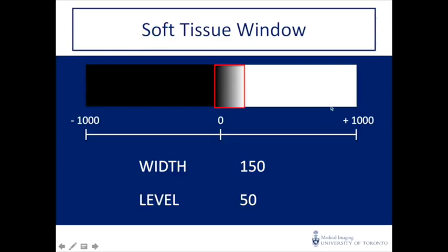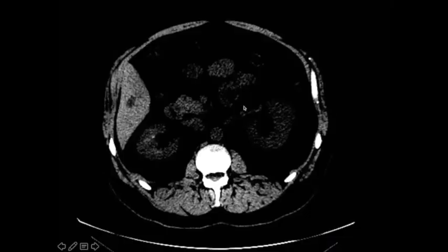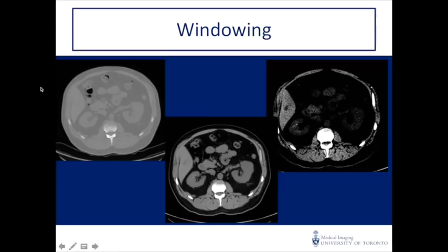So let's pull up a CT slice with this particular window. So this same slice, the hypodensity in the liver looks even more conspicuous. We can compare them side by side, and we can really see how much more conspicuous it is when we narrow the window. But focus on the principle. We need to understand that windowing is very important moving forward to help us detect clinically important abnormalities, including strokes in the brain, pulmonary emboli in the chest, and free air in the abdomen. These are just a few examples of things that can be easily missed if you don't window properly.